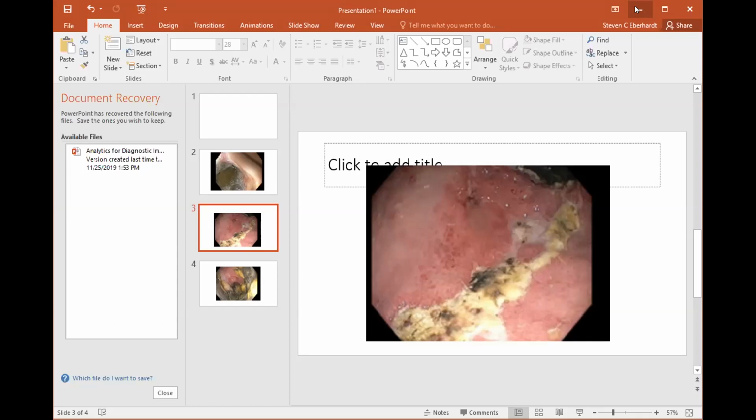Go ahead. One other possibility, I remember in residency, they told us that the majority of gastric emphysema is not pneumatosis, but it's basically dissection from trauma from an NG tube. So she had an NG tube too. She could have already been at risk because she was so stressed out. And then they put the NG tube and it sheared the wall, and then the air can easily dissect into the wall. And so it's not actually a sign of ischemia, but just of translocation.